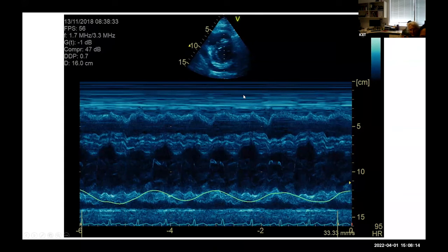All right, so this is the M-mode through the LV. This is RV and this is LV. So this is again another good M-mode position to show any collapse of the right ventricular wall. Okay, so this is expiration, this is inspiration. Is this normal, the collapse? Because we'll have a little bit of collapse anyway, isn't it?